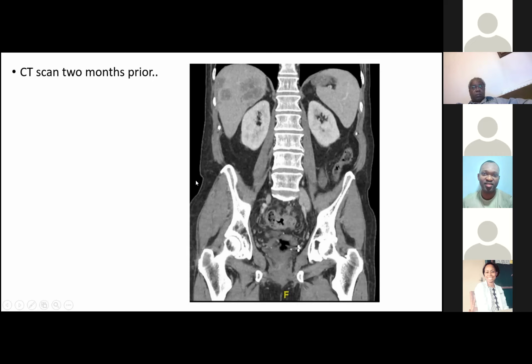A lot of these patients are having abdominal X-rays. In fact, most of them in this presentation have had a CT scan, which begs the question: why do you do a plain film in the first place? Like I said, they are useful, but they mustn't delay you accessing the correct test for your patient. And in this patient, there was a short delay between the plain film and the CT, but certainly the plain film was useful to some degree.